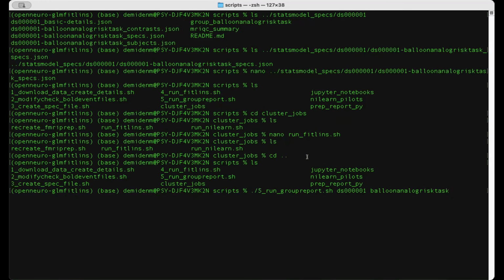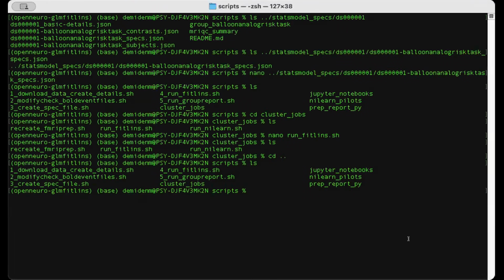So again, it'll effectively run, check a bunch of information, grab some files, and I'll show you the report it creates, rather than going over it here because it's not visually appealing here anyways. So that's the whole process of running this workflow.